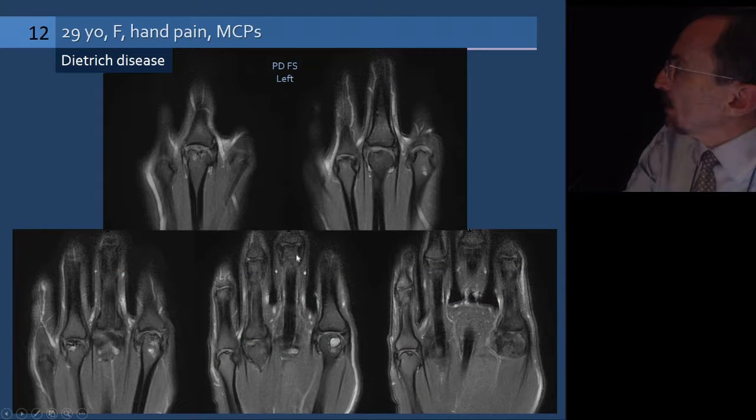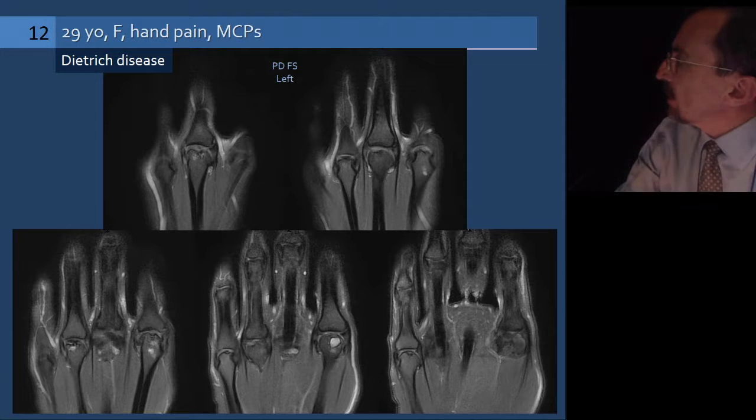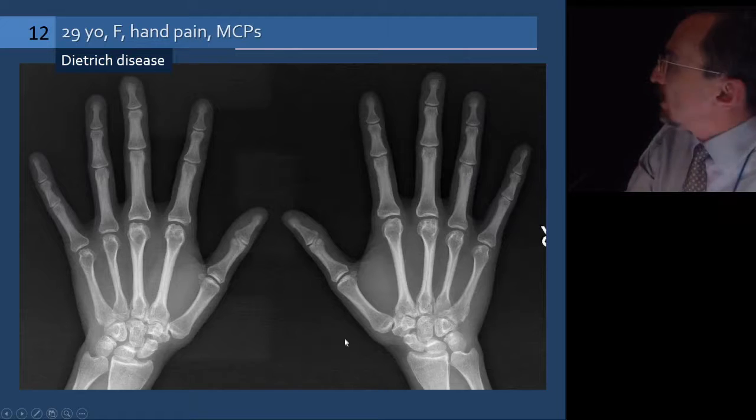So once again, the distal aspects of the MCP joints are fine, no joint effusion, PIP joints are okay, and apparently we have the avascular necrosis and the ensuing irregularities and resorptions and the somewhat distracted appearance of the metacarpal heads. And those are the plain films.